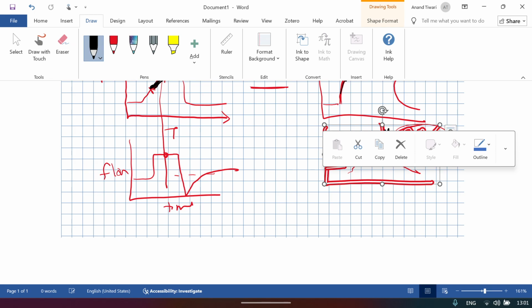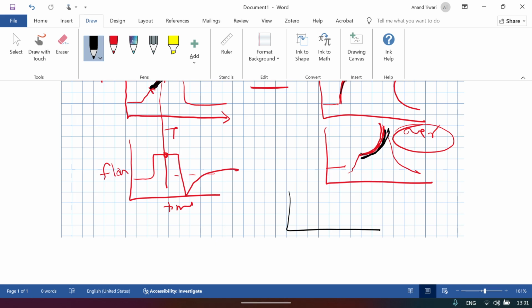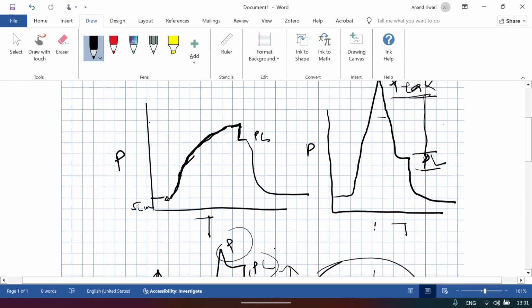On a pressure time curve, if you see this graph with a lot of concavity downward, this also signifies that the patient is actively doing the work of breathing. The inspiratory effort is here, so this is pulled down. So this signifies that the work of breathing is being done by the patient. You need to sedate, or you need to set your ventilator accordingly.